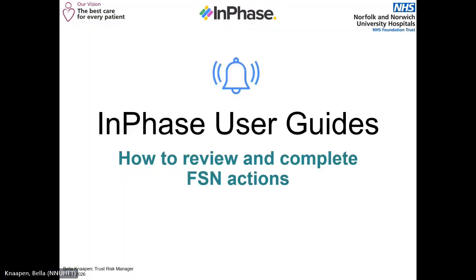Hello, and welcome to this short video on how to review and complete field safety notice actions from the perspective of the clinical team.